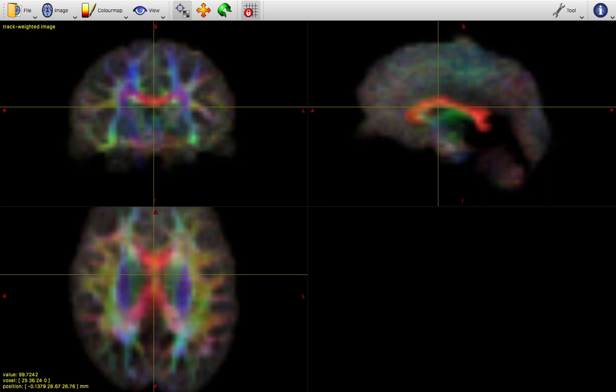So I'm about out of time. This is all I had loaded for the practical. This will just get you off the ground. These are a couple checks to do, some pretty basic ones. And as long as you buy their logic for their use of their basis function, I believe it's a superior way to analyze the diffusion data.